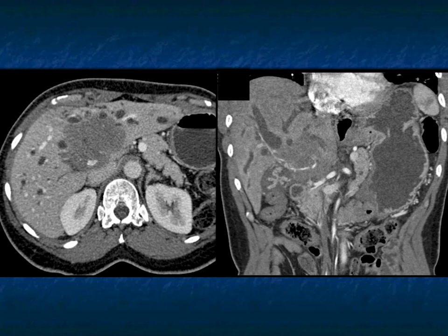But if you've got to think beyond there, I do want to make the point that one disease that we don't think about very commonly in the liver is lymphoma. Lymphoma can involve the liver when there are multiple nodes elsewhere and multiple organ involvement, but I don't see anything else here. But you can get primary hepatic lymphoma. It can be a solid mass which is infiltrating. You can see in this case, look how it infiltrates around the portal vein. The portal vein is encased, but it's not occluded. So what about lymphoma?